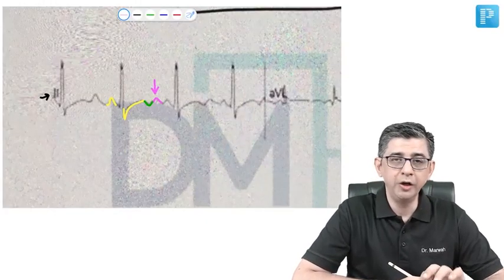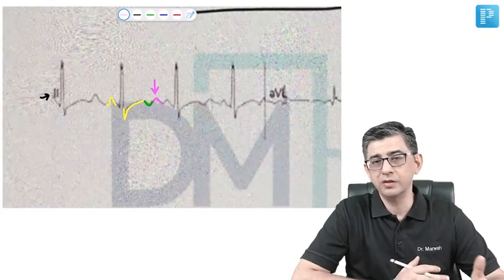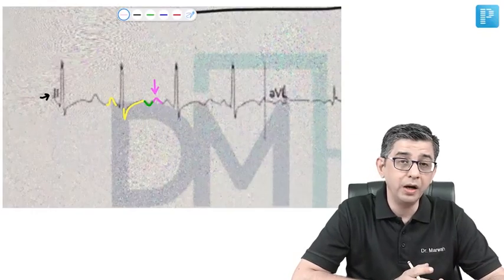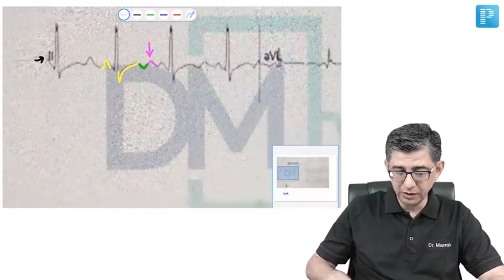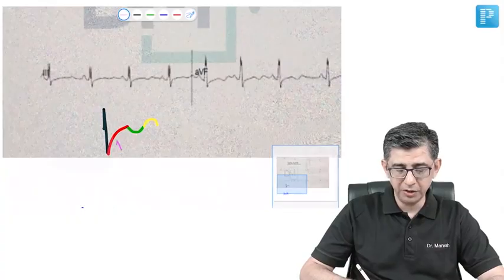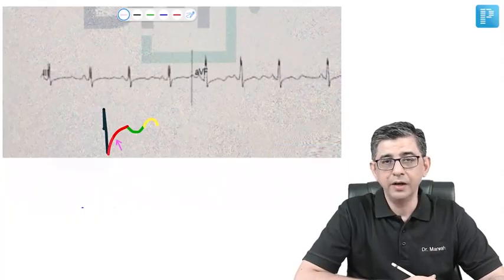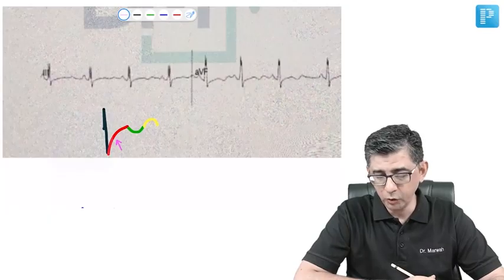Remember, I had told you that a U wave is found in the ECG of a normal person due to a delayed repolarization of papillary muscles, but here I'm pointing at prominent U waves. As far as these color changes are concerned, I have done this once again. ST depression that I am showing in red, then the green, which is T wave inversion, and the yellow there is representing a prominent U wave of the patient.